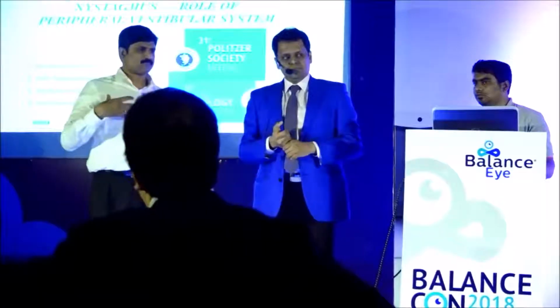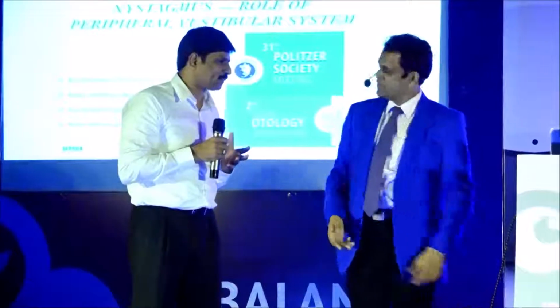So there is one more issue that we face, especially what I face is, the person actually comes with an MRI. Already done MRI. And then you know that it is an inadequate MRI. Correct. So in case of such a patient, I ask for a repeat.